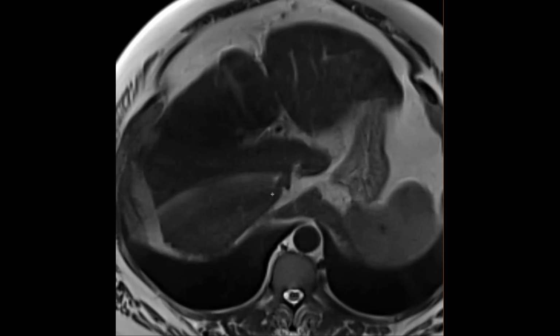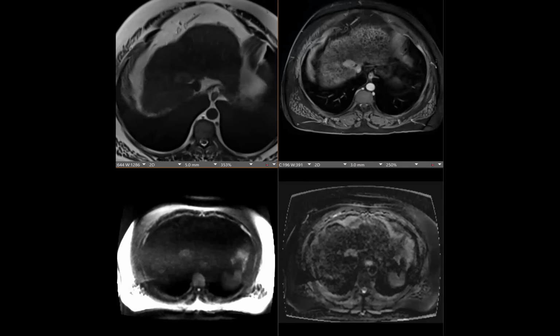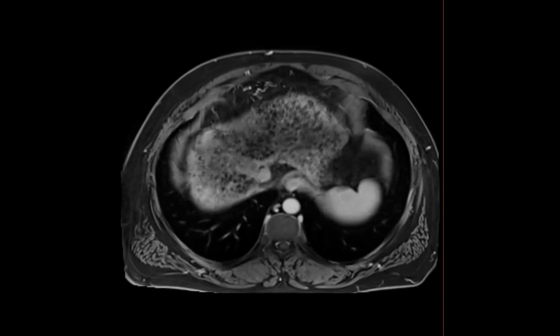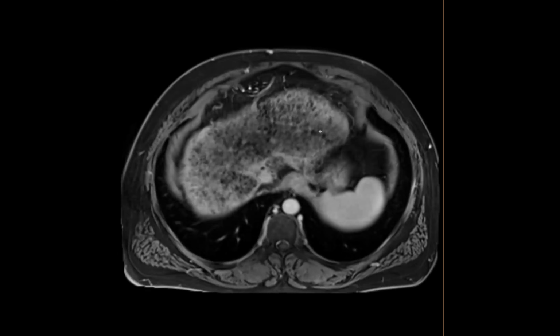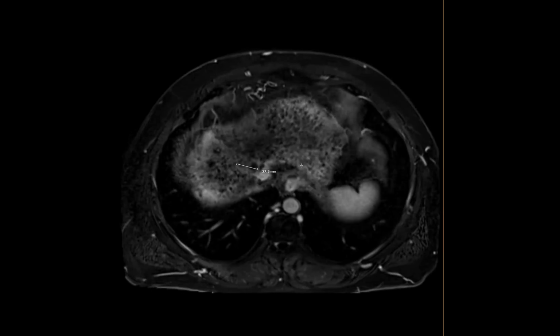It's abnormal. Yeah. Dysmorphic. Not washing out? I don't think so. Let me pull it up just to confirm. No. Although there's so much cirrhosis in the liver that. Sorry, I missed this case. There's an enhancing lesion in a patient with a background liver disease that has. Oh, sorry, that's post-treatment. Sorry, go ahead.